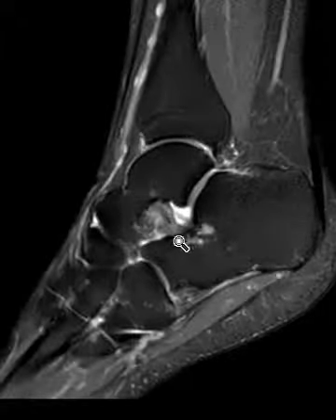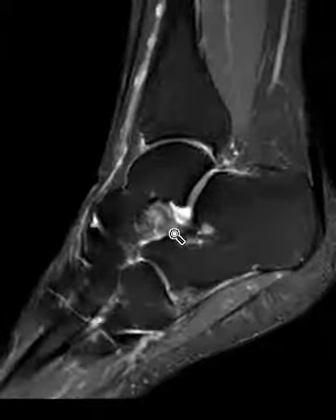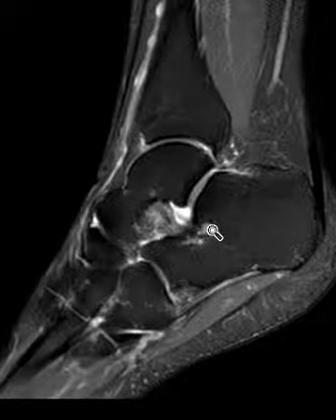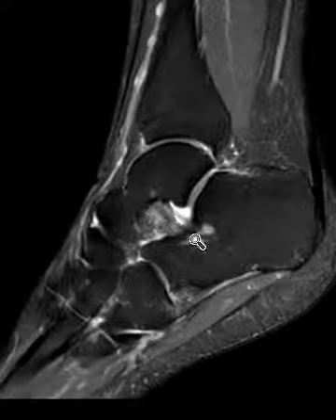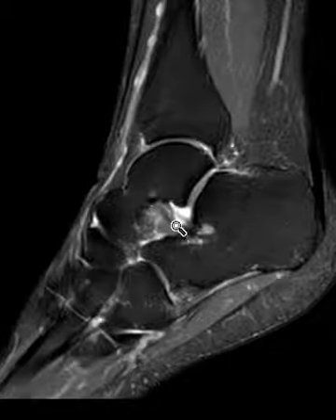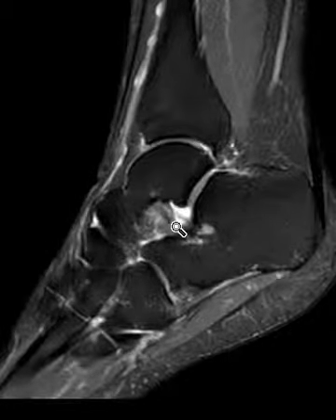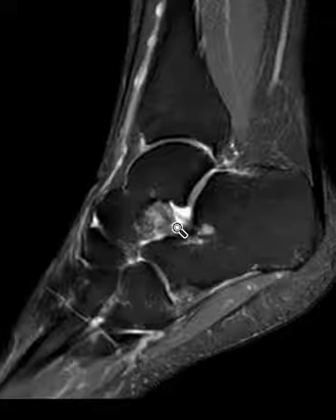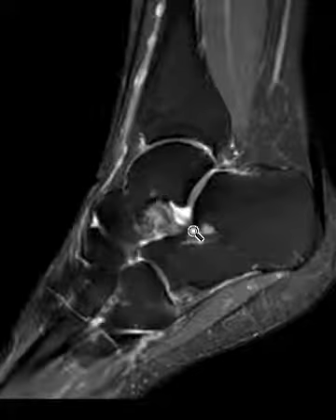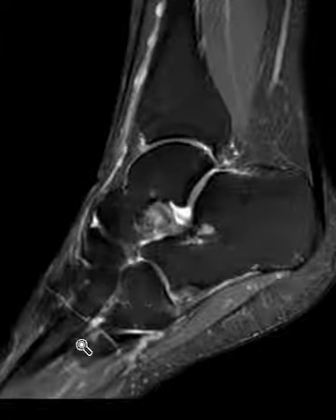So it looks like they have some mild inflammatory changes in the sinus tarsi, and again, these little enthesiopathic changes can be normal, or they could be related to some abnormal mechanics of stress with enthesiopathic reactive changes. So when we see anything in the sinus tarsi, we want to look at the posterior tibial tendon to see if they have posterior tibial tendon dysfunction, because when that does not work well, that puts abnormal stress in the sinus tarsi, and it could look just like this.